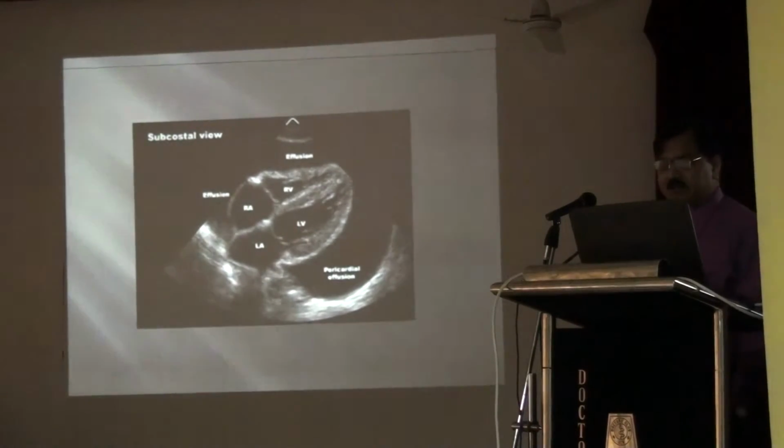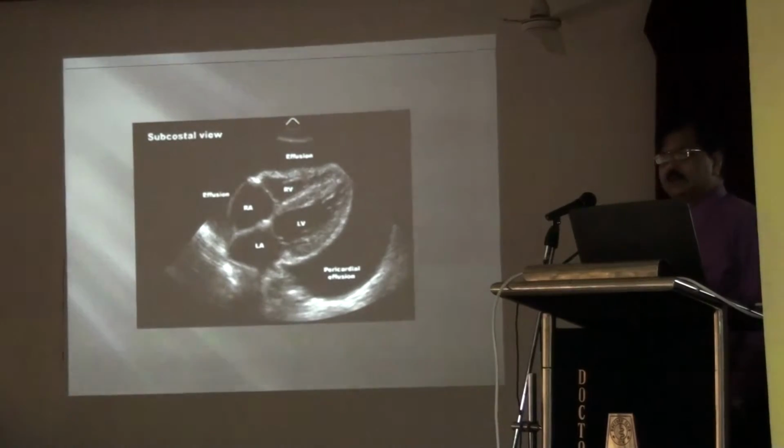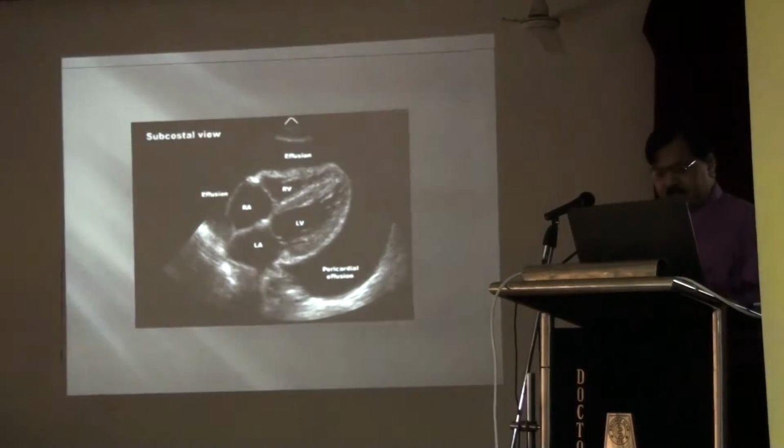When there is a pericardial tamponade, there will be low BP, pulse will go down, and here there will be a sign of compression, RV compression. This is the RV compressing, then there will be no filling of the RV, and that is known as cardiac tamponade, the most dangerous situation. So this is the pericardial effusion, and ultimately the treatment of choice is pericardiocentesis.